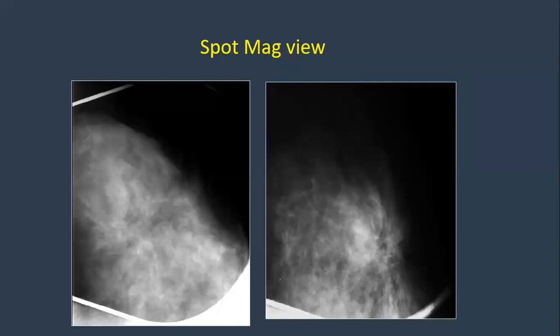Maybe post-procedural changes. So you have to do an ultrasound. Okay, it shows the same area on follow-up, architectural distortion, doesn't add anything more. So you are going to code it as BI-RADS 2, 3, or 4. Which one? And why?